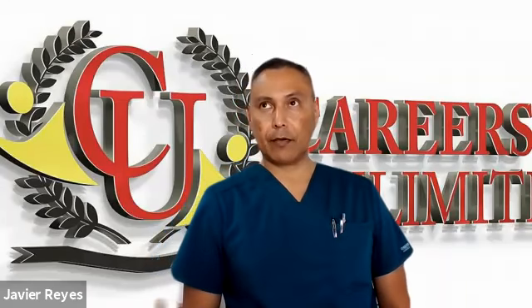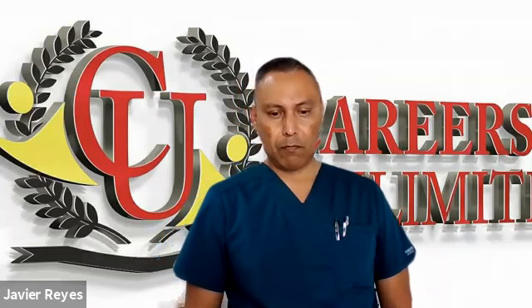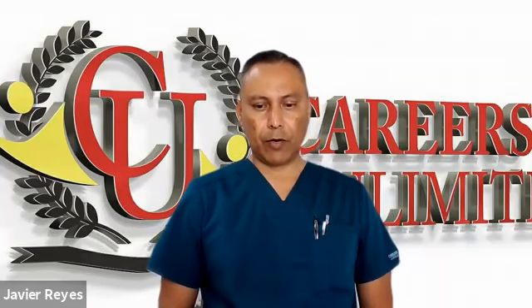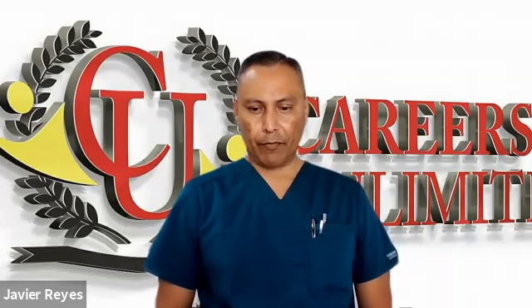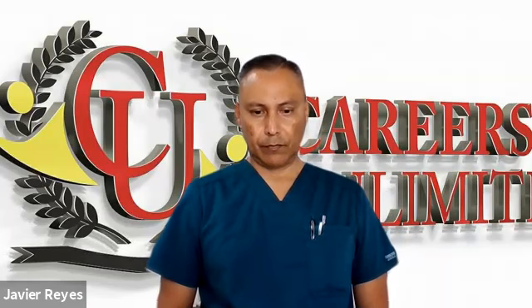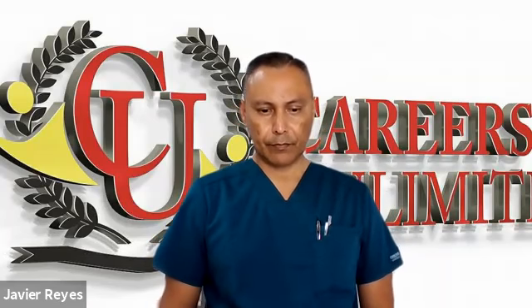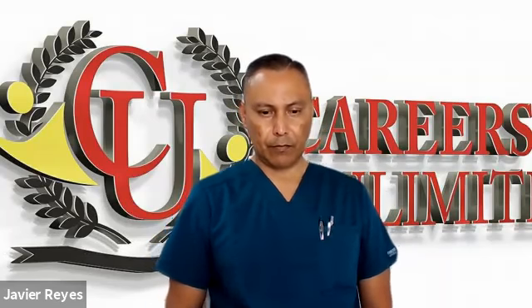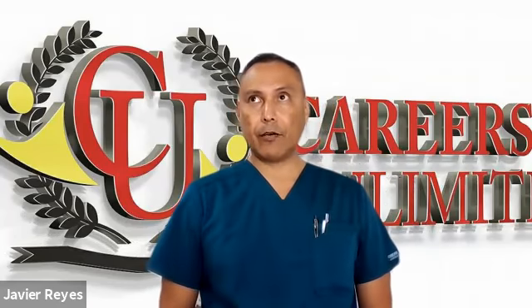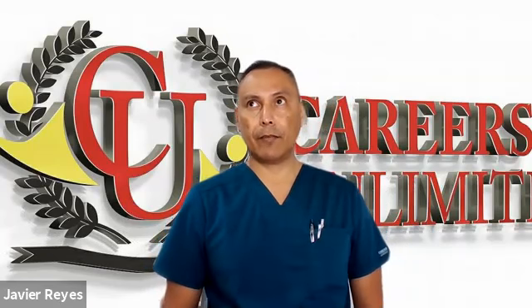Or is it a mix of both? On V1, letter A is a QS, right? It has a QS, so that would be considered a left bundle branch.